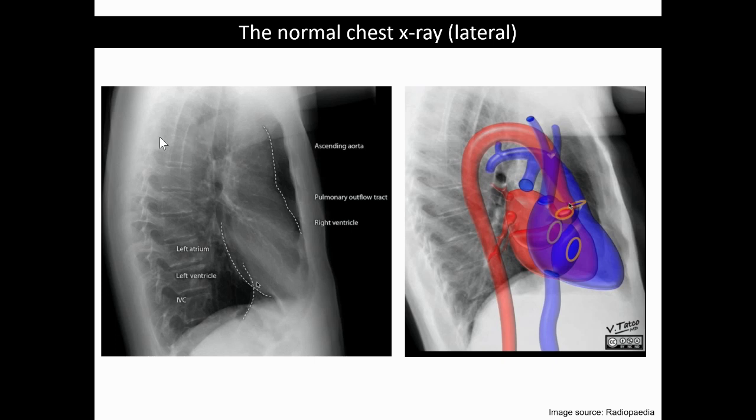So this part of the image remains white, and down here where the photons travel through just a lot of air, the pixels become black, so this area becomes transparent or dark.